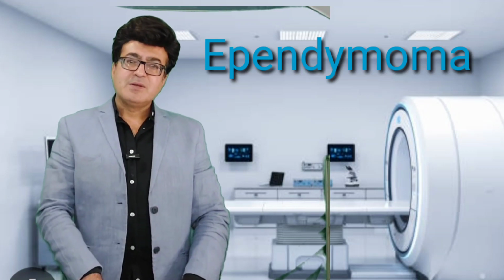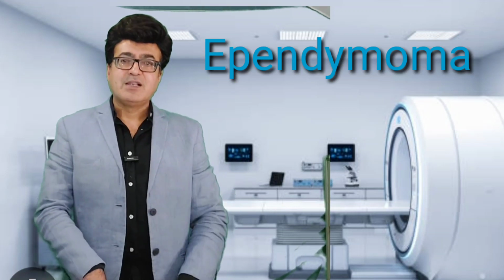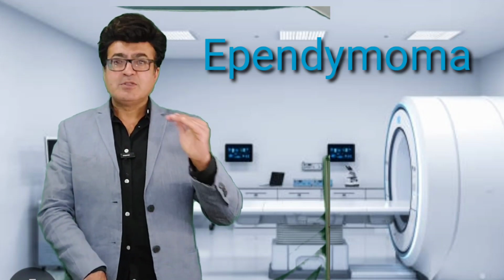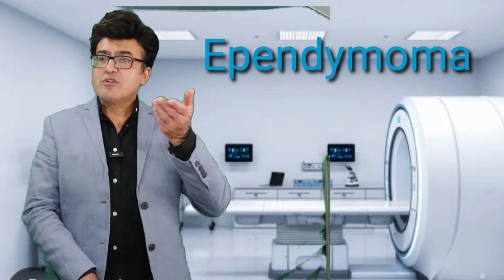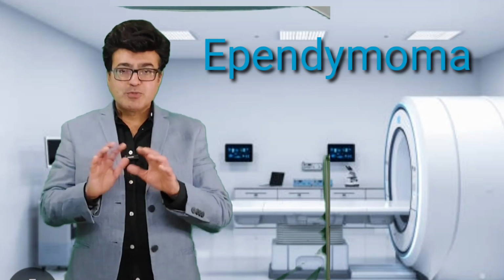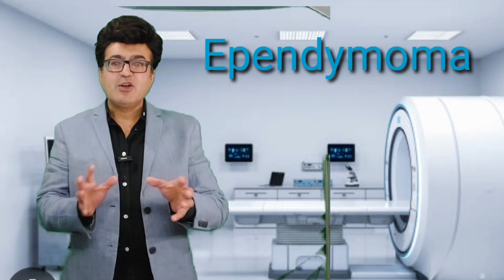The second thing, so far as location is concerned, is that ependymoma involves the floor of the ventricle, while medulloblastoma involves the roof of the ventricle. So far as the shape is concerned, medulloblastoma happens to be round in shape, while ependymoma molds itself according to the shape of the ventricle. So these are all the points.